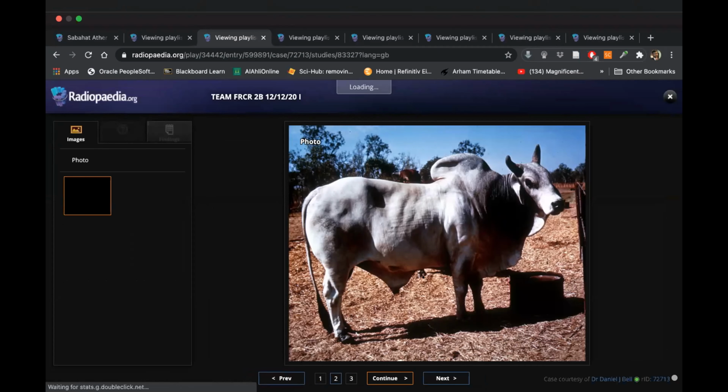Okay. I've lost it. Actually, the last osteochondroma in the pelvis, that was an osteochondroma turned into a chondrosarcoma. Yes, yes. Okay. I just wanted to show you this bull, this Brahman bull. It has a widened neck, and that is why that look of the osteochondroma in the neck is called Brahman bull appearance.